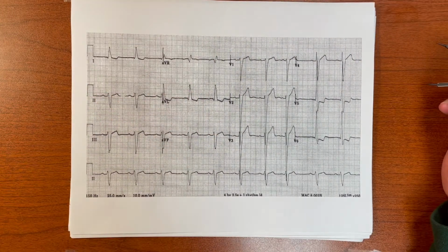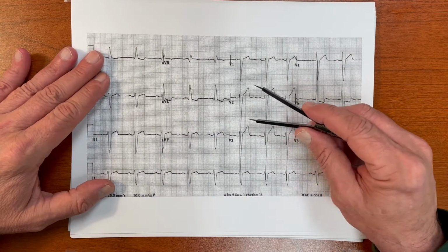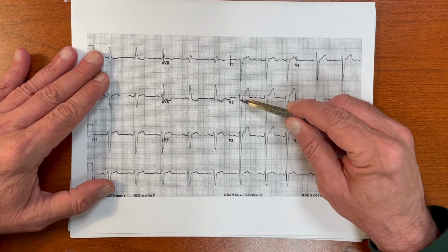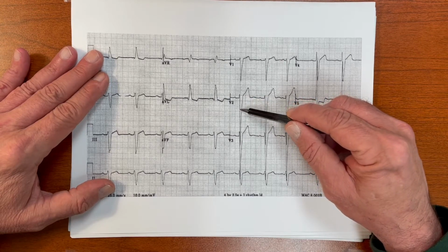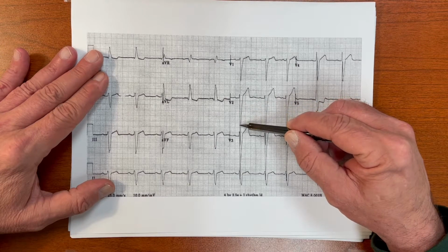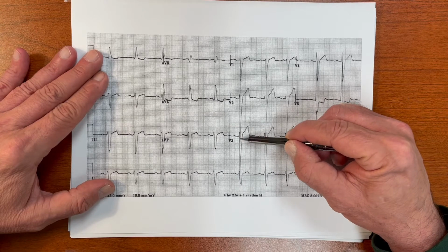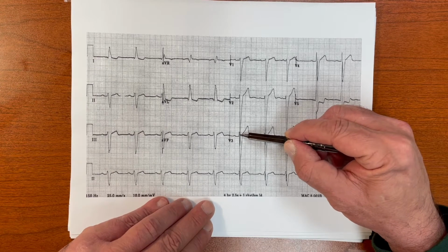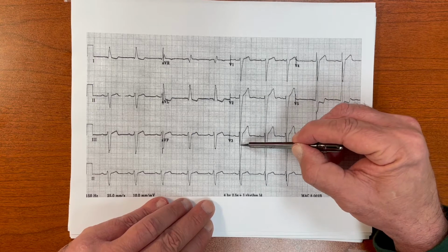That's a great question. You can do that, but you don't need to, because you can train your eye, just follow the line. For example, the S, okay, you have a single intensity, okay? It's iso-dense, the same intensity all the way down. Then all of a sudden, it continues, and then it becomes hyperdense because it's superimposed. So wherever that double intensity ends is where the R wave ends. So you ought to be able to pick that out.